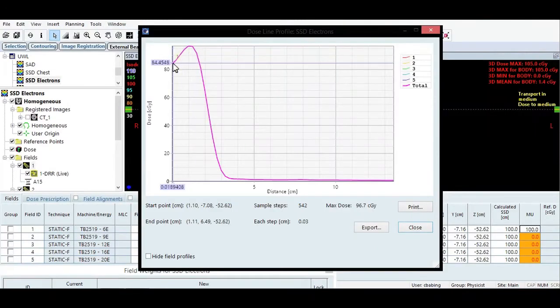So you have a skin dose, you have a surface dose, we have a Dmax, which in this case is right around 1.4, 1.3, and then you have a rapid fall off. You have extraordinarily rapid fall off. R sub P is the practical range. Take the tangent line down the steepest slope of the percent depth dose curve. It takes you right around 3, which is 6 divided by 2. So the energy divided by 2 gives you the practical range. And then after the practical range, the only dose to the patient comes from Bremsstrahlung contamination within the head of the machine.